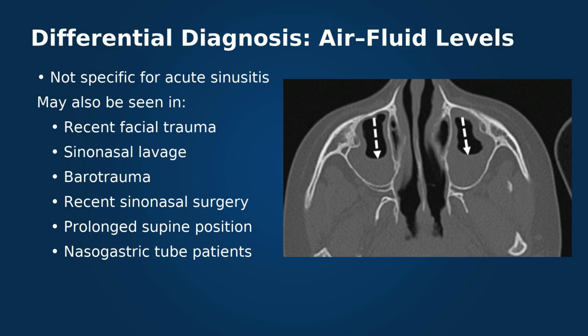Differential diagnosis should always be kept in mind. For instance, air fluid levels within the paranasal sinuses are not exclusive to infection. They can also be encountered in patients with recent facial trauma, sinonasal lavage, barotrauma, recent surgery, prolonged supine positioning, or in patients with a nasogastric tube.